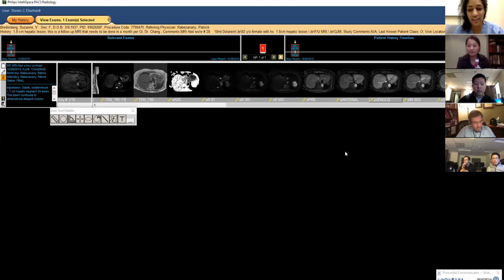Steve, I have a suggestion. It could also be a sclerosed hemangioma. That's one of the benign things that it could be. Yes. The little T2 vagueness and the fill-in is decent for it, and even the geographic shape, kind of a little rectangular, triangular, an elongated thing, like an old one.